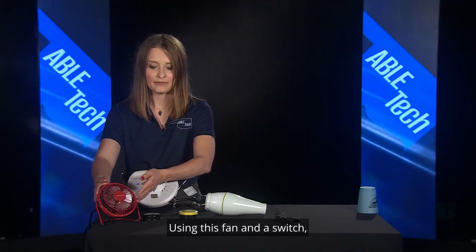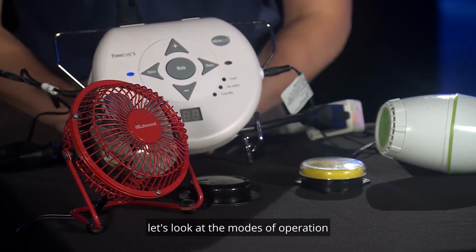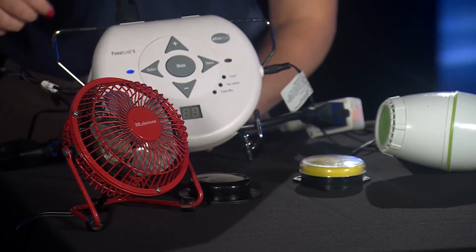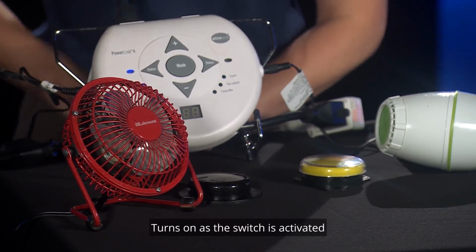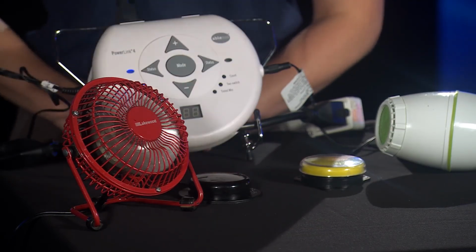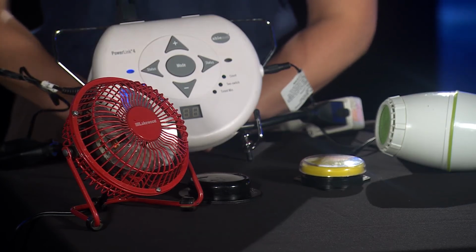Using this fan and a switch, let's look at the modes of operation available on the PowerLink 4. Direct. Behaves like a traditional switch device. Turns on as the switch is activated and turns off as soon as the switch is released.